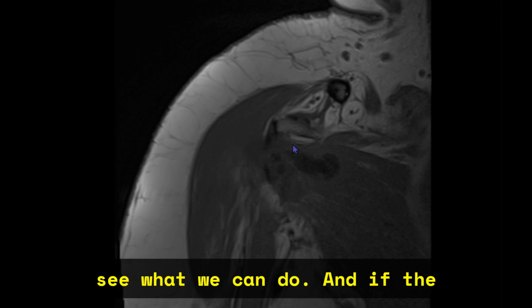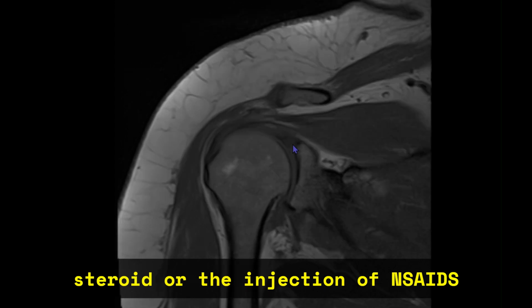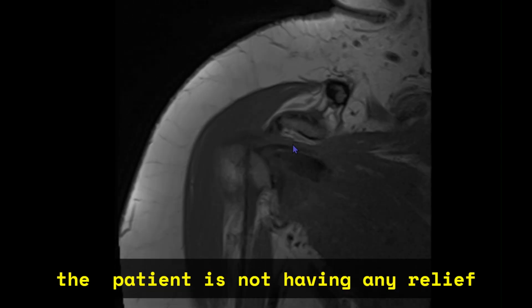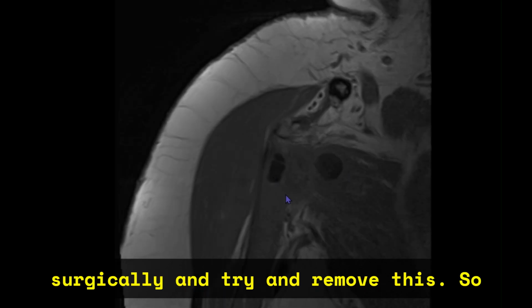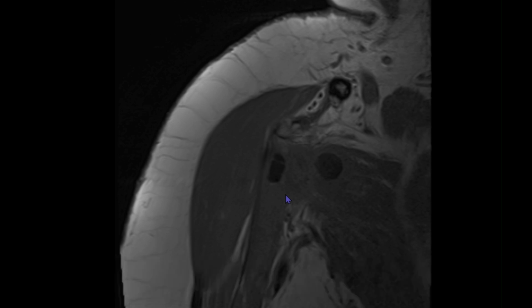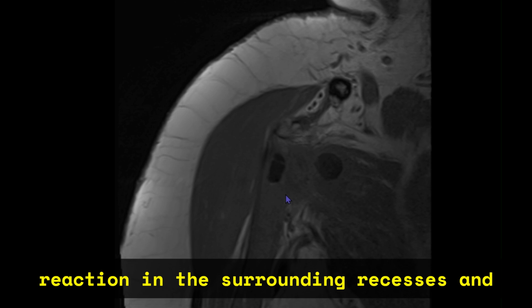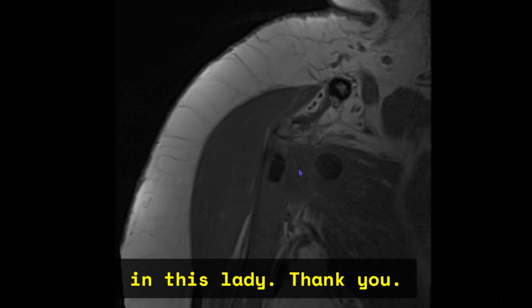And if the pain is so severe that even after steroid or the injection of NSAIDs the patient is not having any relief, then we'll have to go in surgically and try and remove this. So this is nothing but a mineralizing type of tendinopathy, or a calcific tendinopathy, wherein the calcifications have extruded out, and this has led to a significant reaction in the surrounding recesses and the bursa, which is causing the pain in this lady. Thank you.